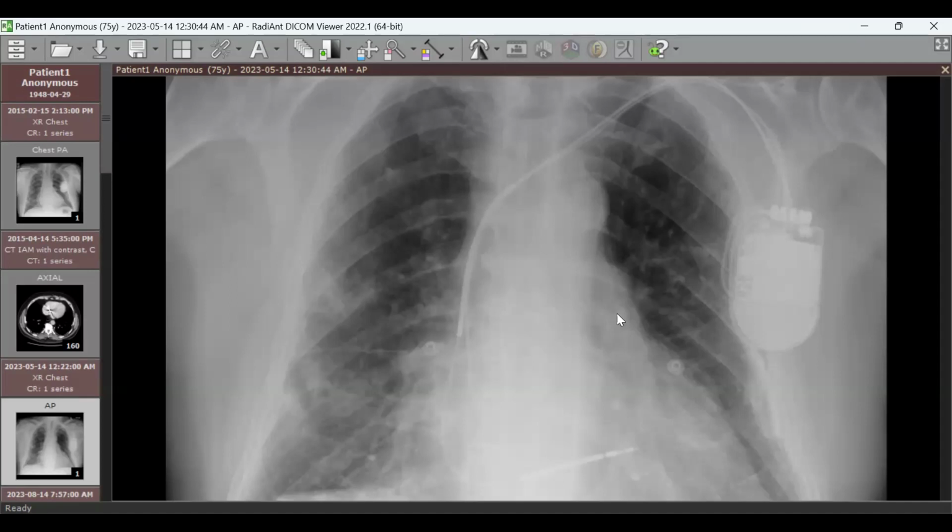This is a dual chamber device. There is a lead inside the right atrium and another in the right ventricle. This happens both with pacemakers and with ICDs, but the main difference is this structure here and this structure here. When you see these wide, opaque structures along the lead itself, different from the normal thickness, this is not present in the pacemaker. This is present in the ICD device.